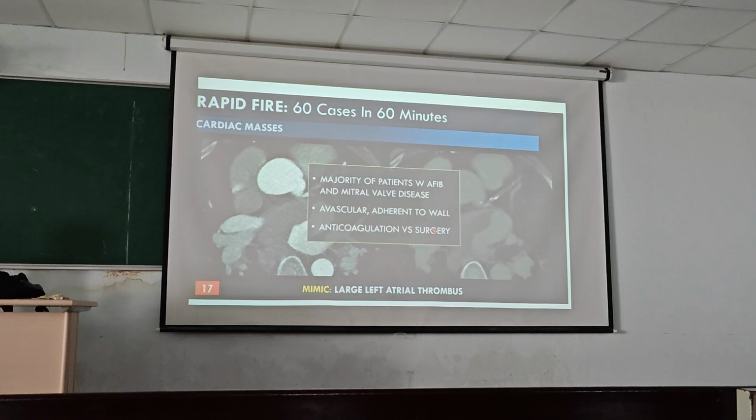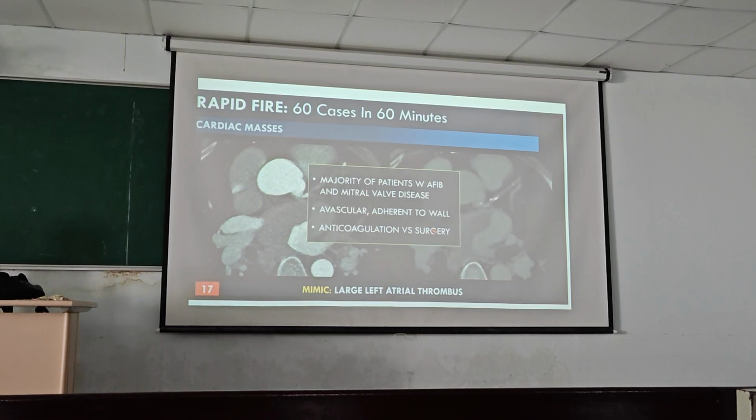Yeah. And what is the more reliable feature? Okay, so on T1 the signal intensity is dark, and it doesn't enhance, and it's also the location. So usually tumors enhance on late gadolinium enhancement, but the clot is not enhanced.